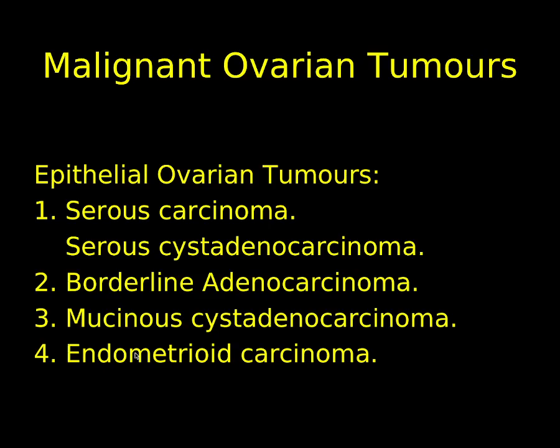These are not that common, but they are of some interest radiologically because they are often calcified, and of course calcified tumours can produce a characteristic appearance on CT, which is very sensitive to calcification. Calcification can be difficult to see on ultrasound, as it can be dismissed as being bowel gas, and it can also be difficult to see on MRI. It's easy to miss low signal calcification. These tumours can also be metastases rather than primary ovarian tumours, arising from the gastrointestinal tract or sometimes the breast.